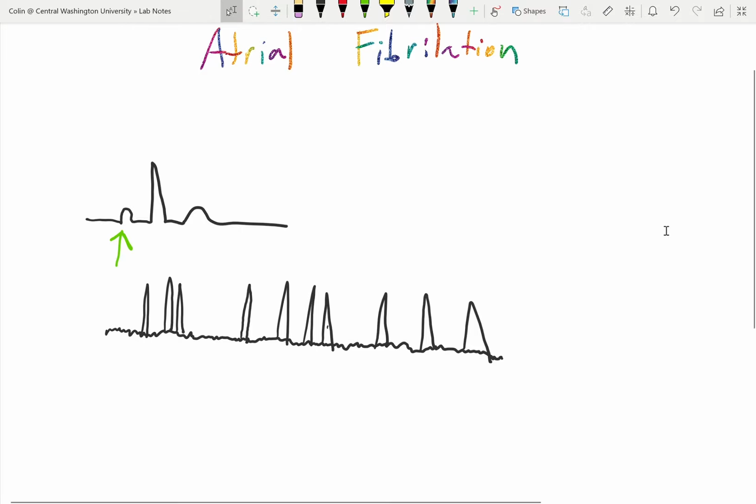So if I were to feel that patient's pulse, it's irregularly irregular. And they're like, I don't know if I have AFib. I have no idea. I don't really keep track of that kind of thing. And then you take a 12 lead and you print it out. And what I see are really nice triangles that all look the same, but they're spaced out unevenly, irregularly, right? And what's in between them is just noise and nonsense. Then it's safe to say that they're in AFib.